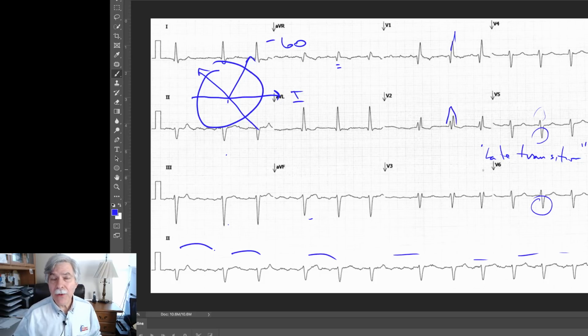But the patient was referred to me because of this irregular heartbeat, and they diagnosed the patient as having atrial fibrillation because it was irregular with no particular pattern to it. And there just seemed to be a little jiggly stuff here that the internist felt was consistent with atrial fibrillation. So he actually put the patient on Eliquis.